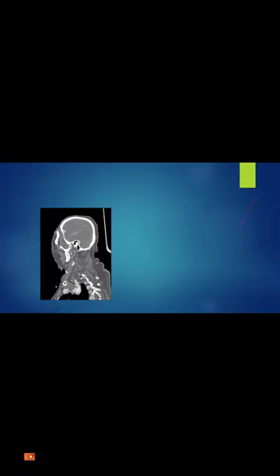Okay, so it is important to consider comparing sagittal thick slabs to sagittal thick slabs of the CT angio in cases where you have a patient with an intracranial bleed or subarachnoid hemorrhage, and the patient is in the hospital and they are repeating the CT angio after 2 weeks or 1 week or 10 days because the patient is developing new symptoms. So make sure that there is no vasospasm.